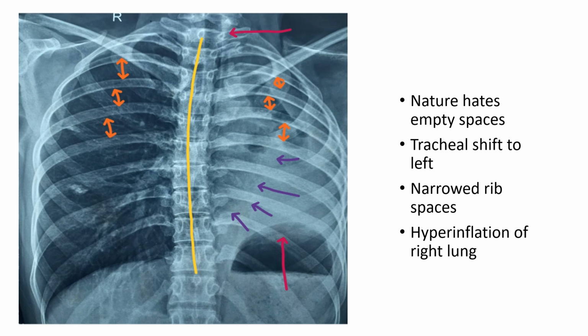This is the first X-ray of this session, and it is also the most important X-ray in this session. I want you to focus on this X-ray because every finding that we discussed in the previous slide is present in this X-ray.